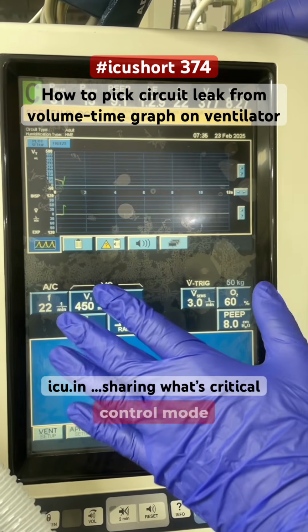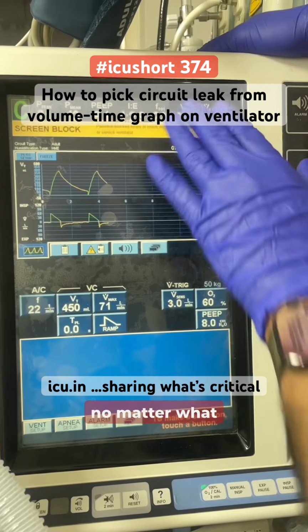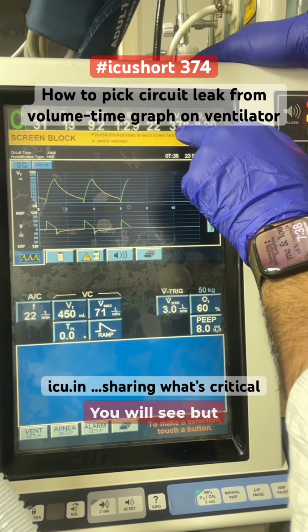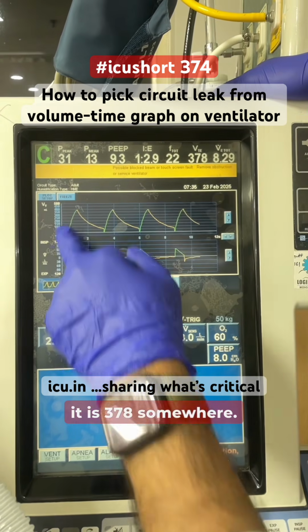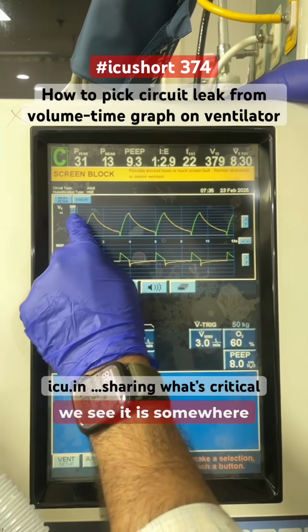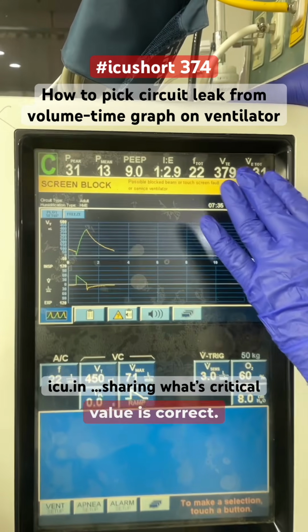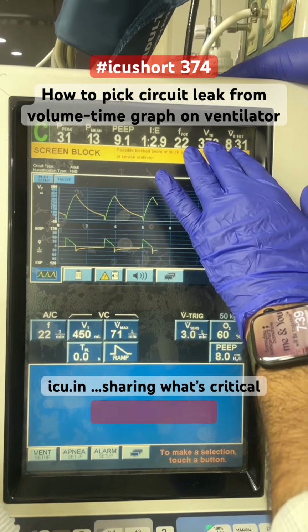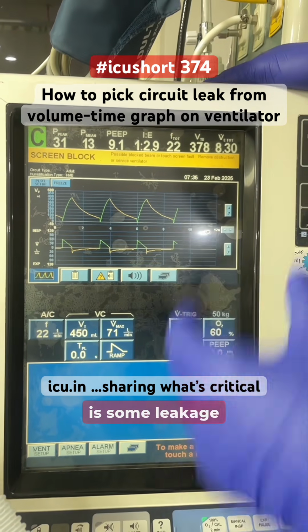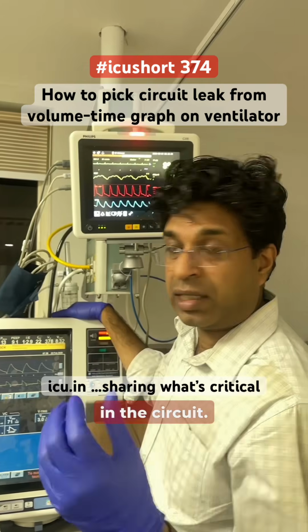But in volume control mode, we know that the 450 tidal volume will be delivered no matter what the settings are. But here the 450 tidal volume is not coming, it is 378 or so. On the graph also, we see it is somewhere around 400. So the set value of 450 is what we targeted, but it is not delivered. That means there is some leakage of air in the circuit.